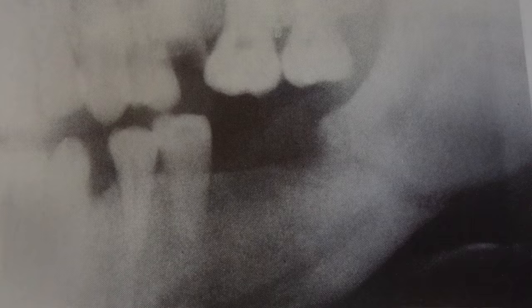Oh, wow. So how about jaw fractures? The mandible is the most commonly broken bone of the face, probably because it's the only movable one. In the case of detecting a mandibular fracture, we need to take a panoramic x-ray. That way we can see the entire dentition and the jaw all together. And like with a root fracture, a jaw fracture appears as a radiolucent line.